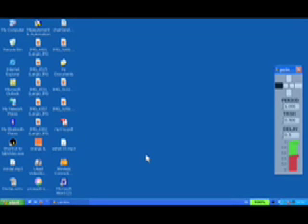This is an interface that allows Sniffs to control the entire computer. The interface window is on the right of the monitor. On the top, you'll notice 4 directional rectangular bars that blink. By sniffing at the appropriate time, a directional bar is selected, and this then instructs the computer cursor to move in that direction at an ever-increasing speed.